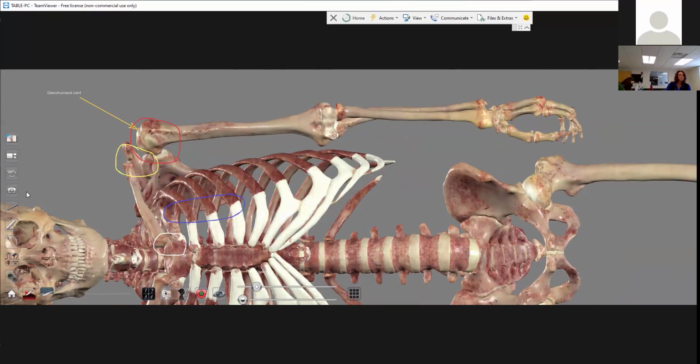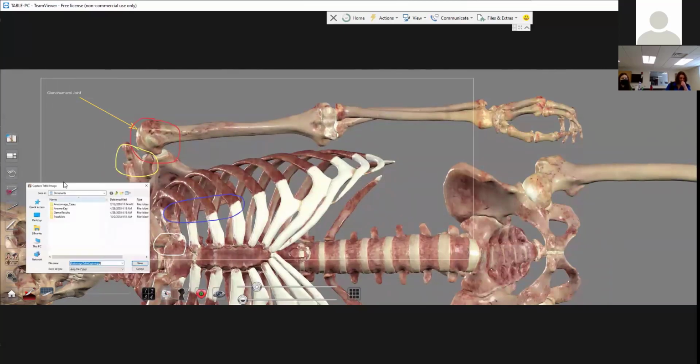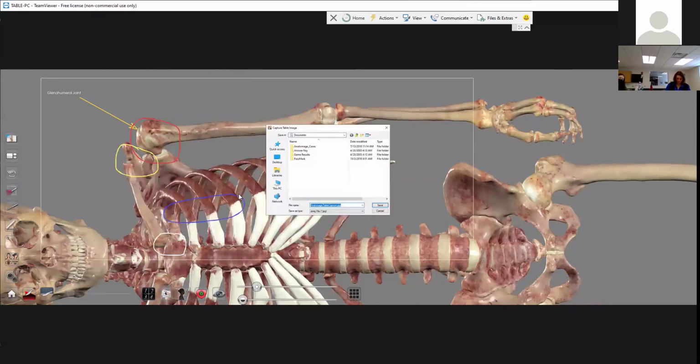And the screen capture tool is just right above the pen tool, so they're right next to each other. And you can take a screenshot with the icons, a screenshot without the icons, or the third one is a custom click and drag to pick a region. And these save, like anything else, just to the desktop or the file explorer.